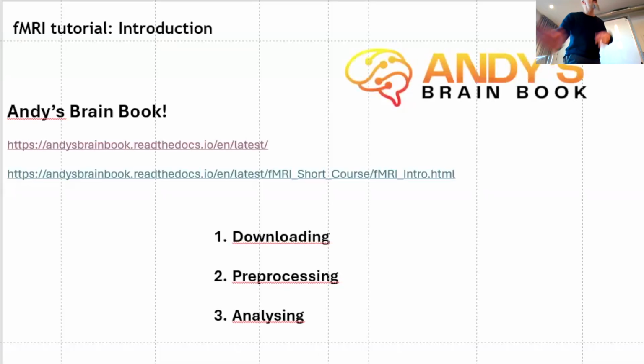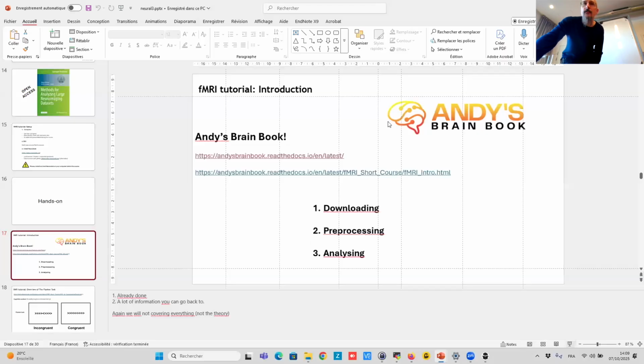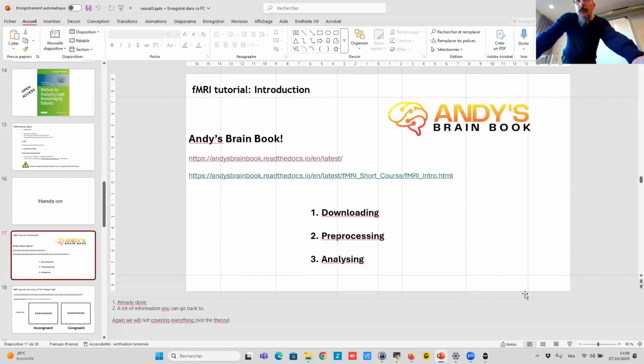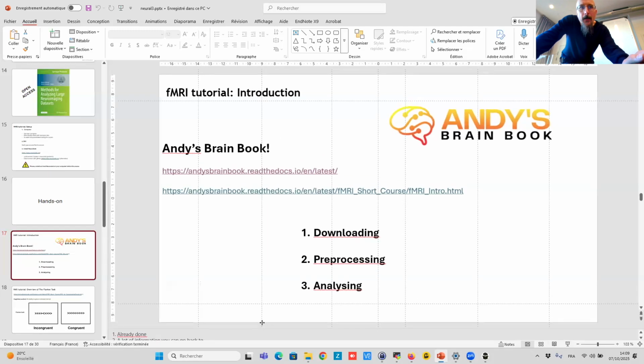So when we have FSL, we will start to work on some fMRI data. Let me see. Oh, you cannot see it. Why is it doing that? Okay, so I cannot open it.